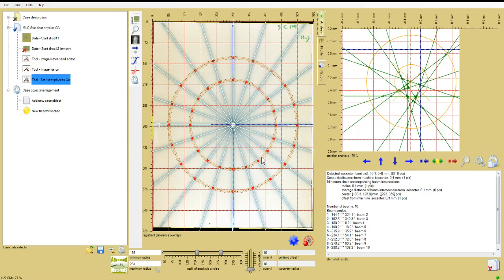Smaller is generally better, but if the diameter is too small, the maxima along the circular path become less distinct as the dose of the film fills in the decreasing space between the beam lines.